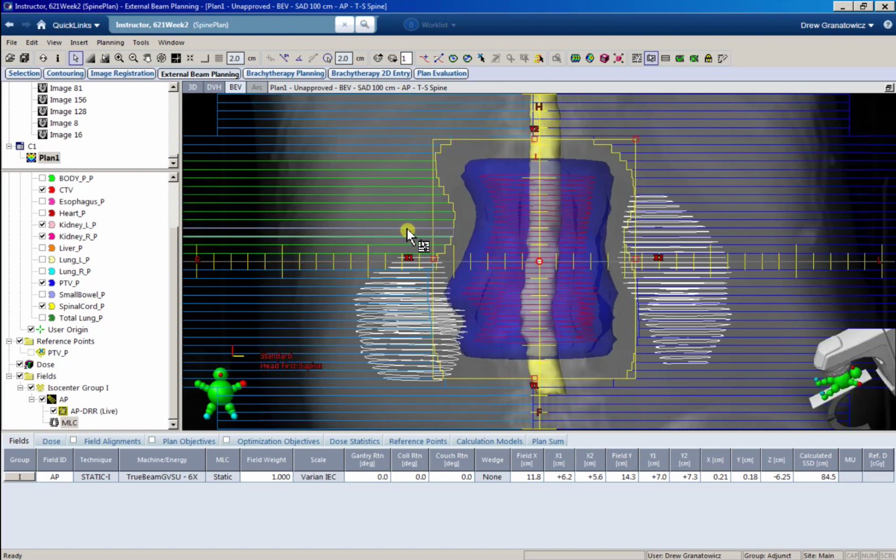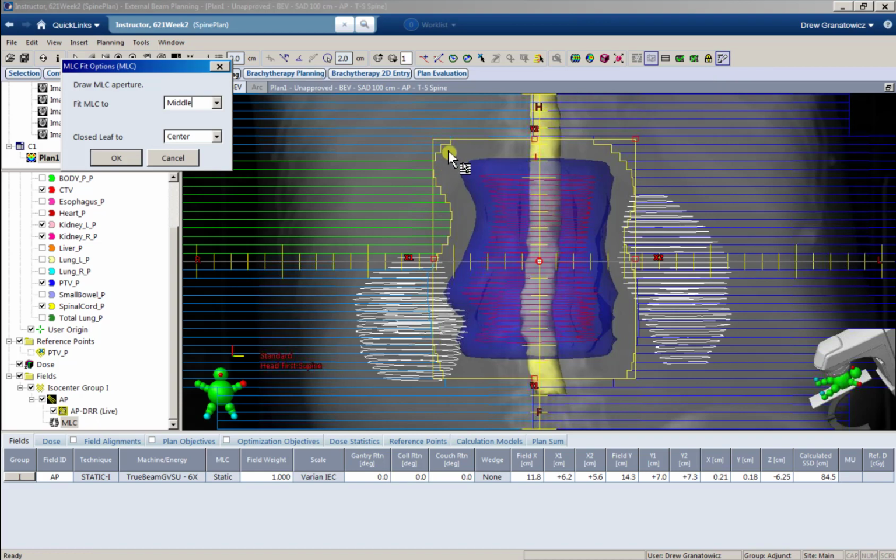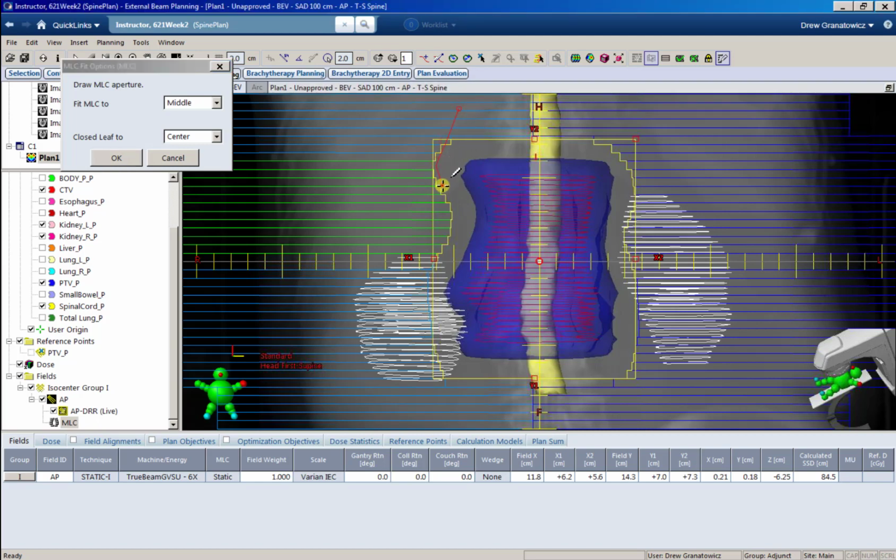You can click and drag those leaves around manually, or again, you can use this shaping tool to move them and shape them. And when you use this tool now, it's only going to move the ones you have selected. So only these green leaves will move. So even if I draw way up here, it's only going to shape these green ones.